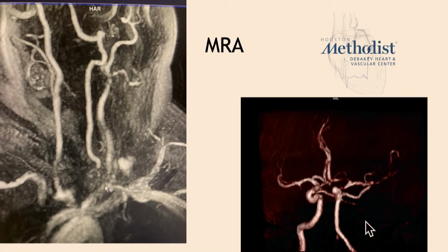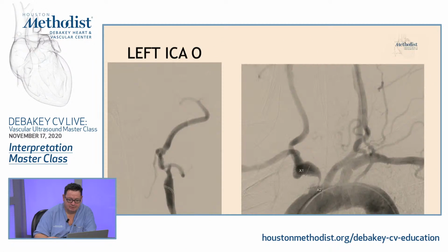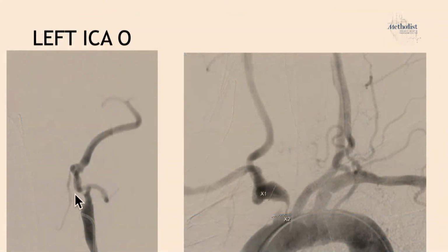The MR also revealed that there's no flow in your left carotid system. So I think the left ICA occlusion is also confirmed by the angio. I will show you the angio first and then come back to this picture. So this is your stump. This is an injection in the left common. This is your ECA, giving you the branches of the ECA. It was stunning that on the ECA we didn't have too many branches, but because its size was almost similar to your common, we mistakenly identified it as a possible ICA with a high resistance pattern, but your proximal ICA is definitely occluded.